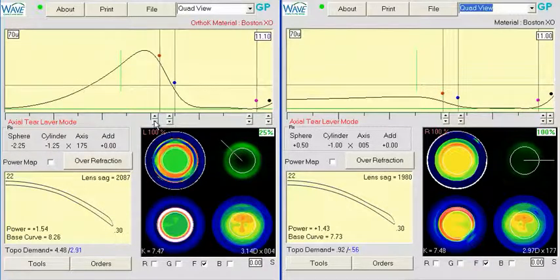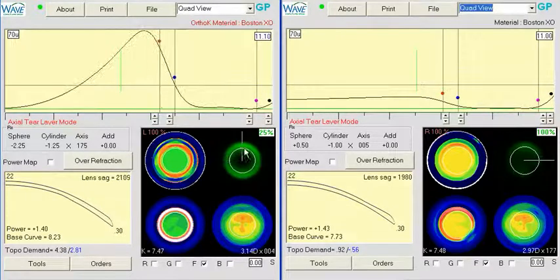Sometimes when we make changes, for example here, we're at 154, I can probably bring this down so it's just more uniform compared to the rest of the lens. And it looks like we can adjust a few of these so that they're closer. Okay, so we're right around 1.4 all the way around the lens right now. And we've got increased demand, and this should help with the patient's residual prescription.